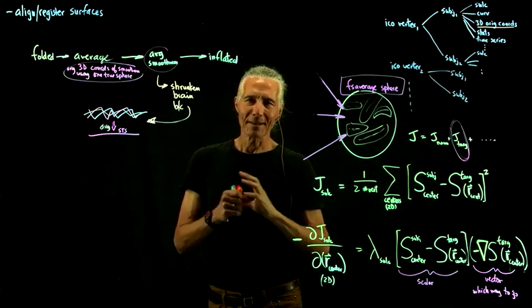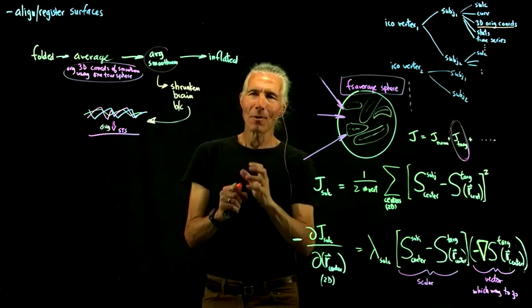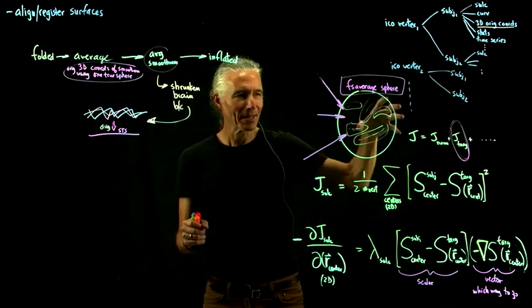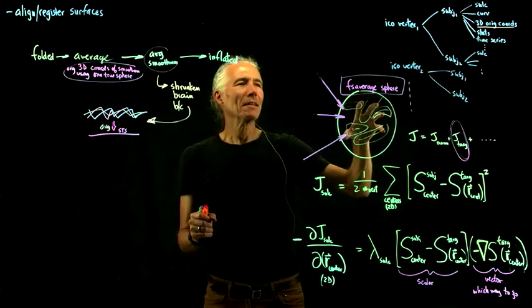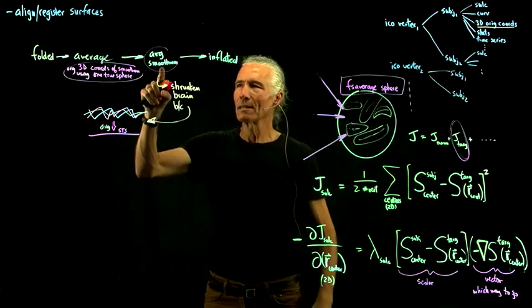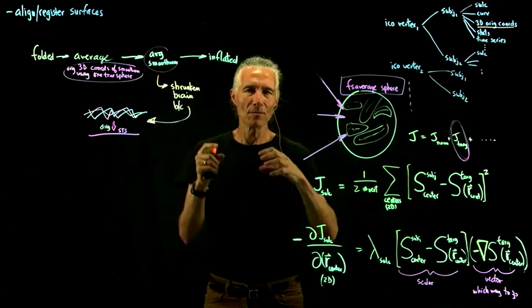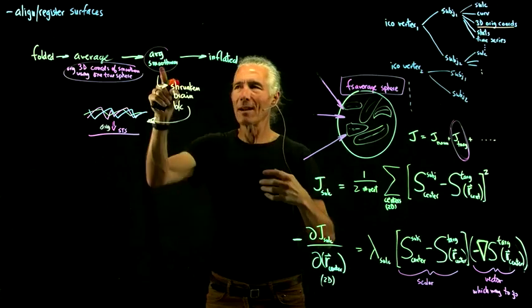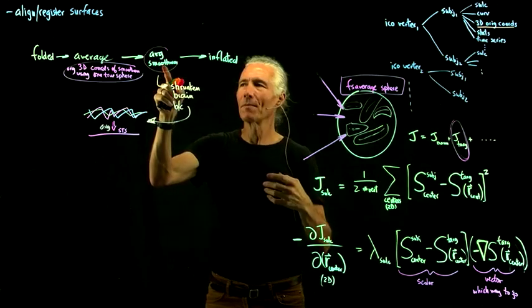But that's not as morally upstanding as doing the right thing and actually sampling things to the surface. But in that case, you have to use this average smooth white matter because you've averaged the data in 3D, and if you want to sample it onto a surface, you need an average surface to sample it onto.